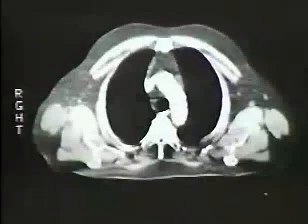Now, I might point out that the esophagus varies a great deal in appearance on CT scans. Sometimes you'll see it like this, with a shape very similar to a lymph node. At other times, it will have a little air bubble in it, sometimes even a double air bubble. Well, you have to adjust to that. Remember the famous rule, there always has to be an esophagus.